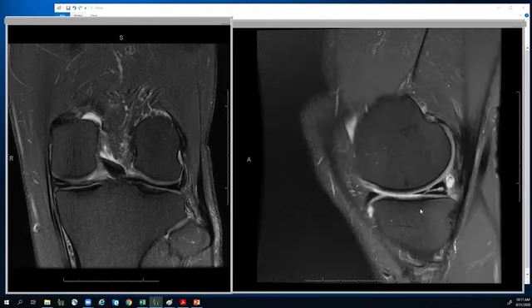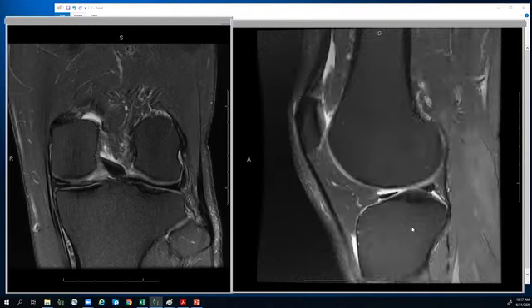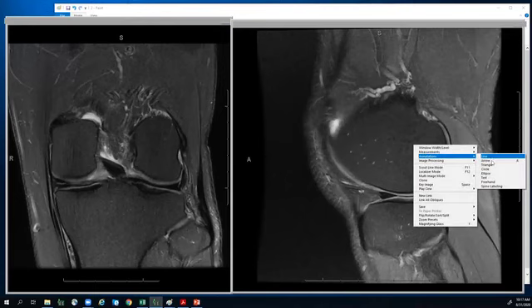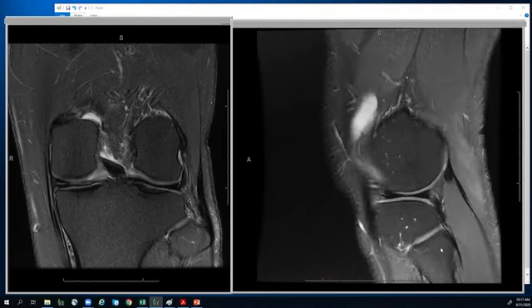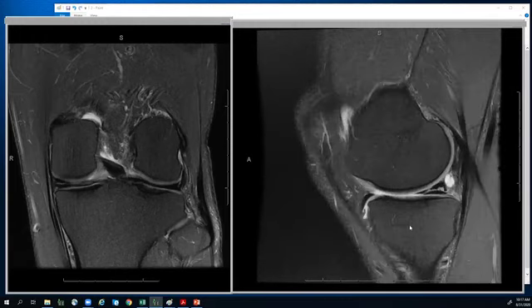So when I'm on the medial aspect of the knee, the key thing is that the tibia takes on the shape of a golf tee, where the medial femoral condyle looks like a golf ball on the golf tee. When I go to the lateral side of the knee, the tibia takes on the shape of an upside down boot. I'll show you that. It has this appearance where it looks like an upside down boot or a hockey stick. Then as I go a little further, I can see the fibula. That helps me find that I'm on the lateral side of the knee, and this is the medial side of the knee in the sagittal plane.